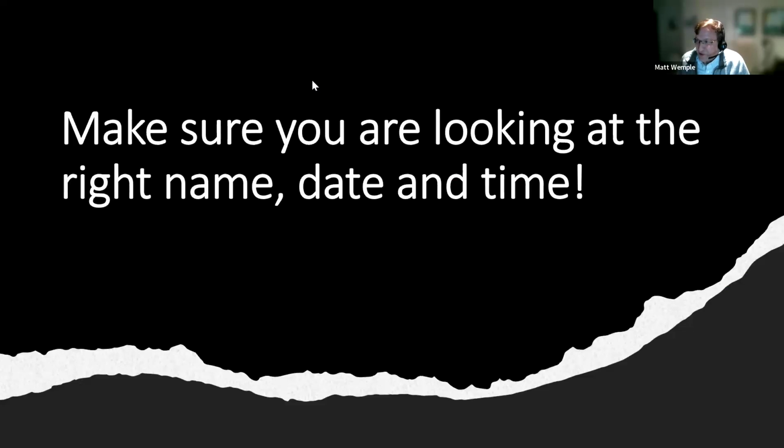So step one is to make sure you're looking at the right date, name, and time. And this gets you mixed up all the time, actually, especially in this computer system where you can pull up films very easily. You might have a chart open and pull up a film for somebody else that you don't mean to be looking at, and it's not going to help you make a diagnosis on the patient that you really care about.